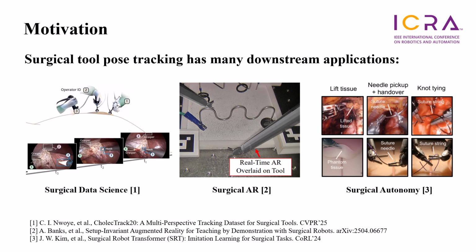In surgical augmented reality, accurate pose estimation enables hand-eye calibration, which is the key component to register multiple coordinate frames in our system. Teaching robots to do surgery is another exciting task. Some recent works learn the policy of autonomous manipulation from 2D gripper trajectories. Without pose estimation and tracking, this method would be impossible.